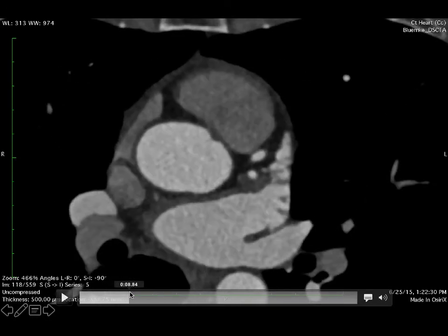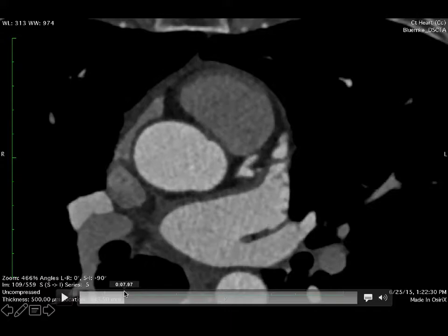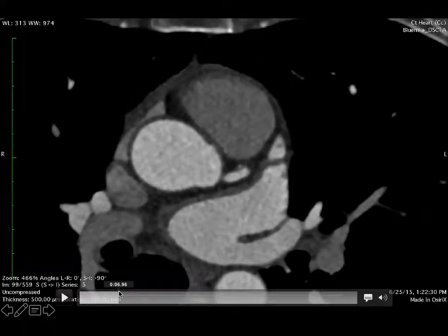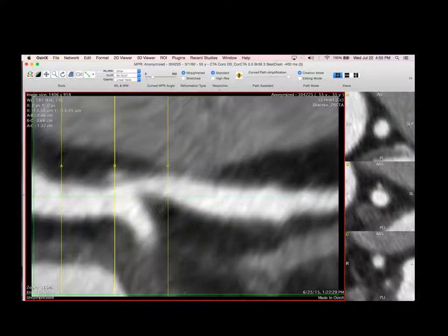And you can see I can either do it by going up and down, as clinicians do, or you can cut the 3D volume in an angled plane to try and get all of the stuff that's interesting in one image, right? And you can even cut it in a curved plane, a curved surface that cuts through the vessel and tracks it. They do look at those.